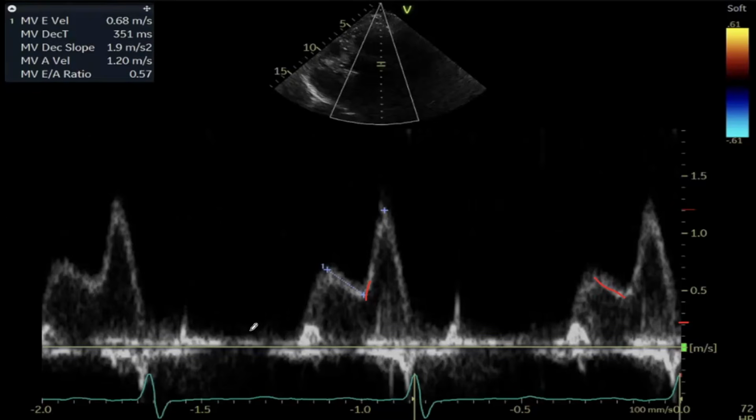But it's part of the reason why I think they moved away from the old nomenclature with the pulmonary veins, S/D, decel time, into this multi-parametric approach where it's the LA size and the E over E prime, because the E over E prime will still hold up here. It gives you guidance, with the RVSP, and then looking at the ratio to determine if you're grade 1 or 2. So that was why it moved away from putting emphasis on the decel time, because remember, atrial reversal and such are not reproducible, which is the problem with it.